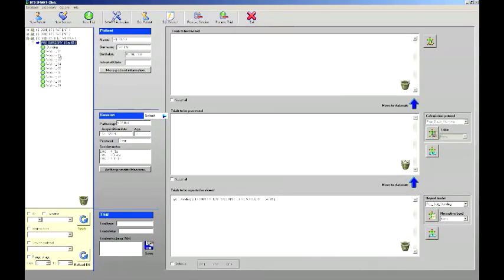Now double-click on one working trial in the database to bring it back into the panel. Remember that for the elaboration of the working trial, the Davis protocol always requires the standing trial. Because you have already processed the standing, the file is in the last panel, ready for the report, but you can move up the file clicking on the blue arrow icon.